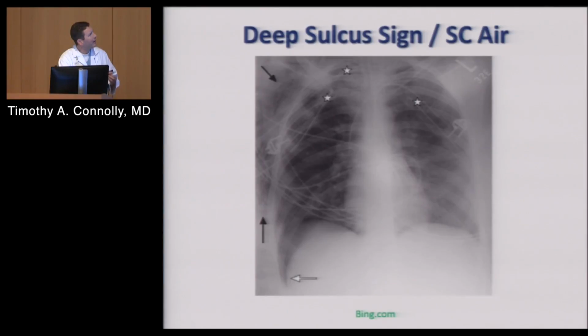You also see over here, do you see this stuff? That's sub-Q emphysema. How many of you have ever felt sub-Q emphysema? A lot. So for those of you who haven't, if you've ever stepped on fresh snow and it kind of breaks underneath you, that's what it feels like. It's got that give. It's a very interesting feel. If you ever have the chance to feel it, you only need to do it once. You'll never forget it.